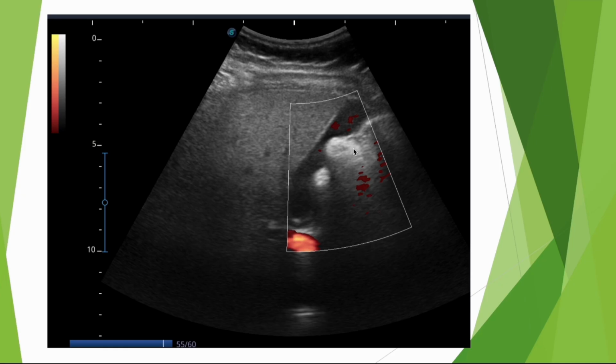It's really not at all the same mechanism as the absorption shadow you might see, for example, with stones. Here, it's a reflection and reverberation shadow, two completely different types of shadows. It's a totally different kind of artifact. So if you know the trick, you won't get fooled.